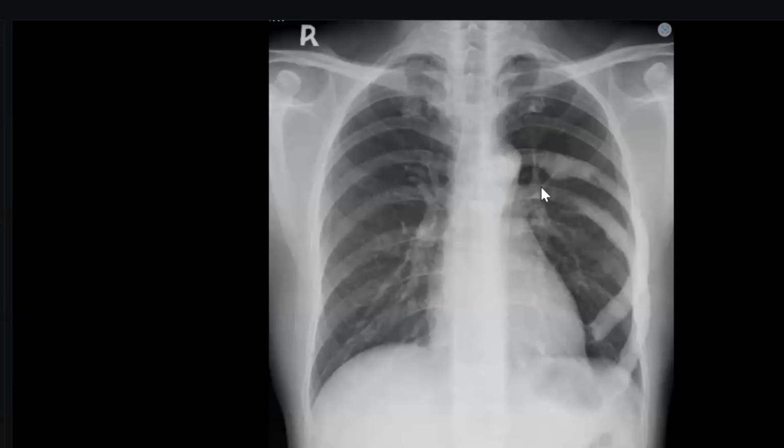Thank you, doctor, so much. This sign is a dripping candle wax appearance. Other differential diagnosis, especially if this patient is an adult, you can talk about sclerotic metastasis, but sclerotic metastasis will not be along the axis like this. It will almost cause some destruction, and it tends to be focal. Okay, my colleague. Thank you so much.